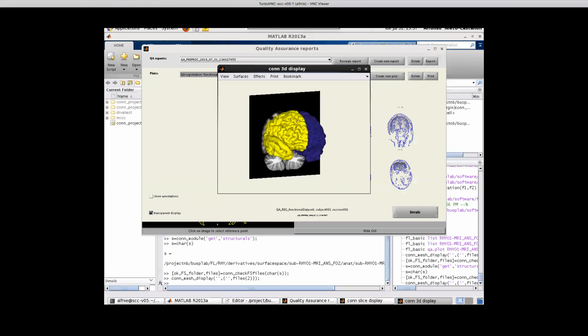One of the things I think would be an interesting thing to do here would be for us to try to actually do that. Would be to load up. I guess we don't have to use it. So with FreeSurfer's tool, you can load up the volume and the surfaces and whatever other individual slices data, like surface or volume data that you want to load on there.